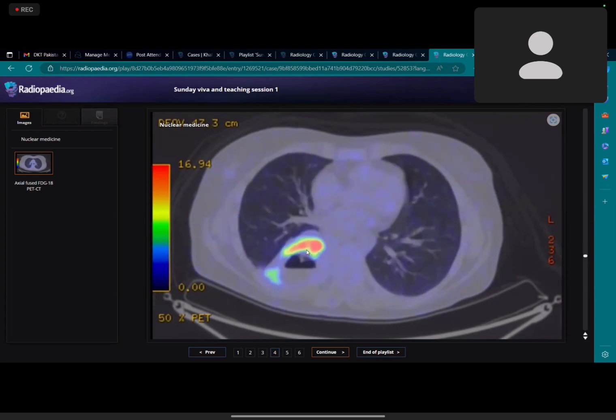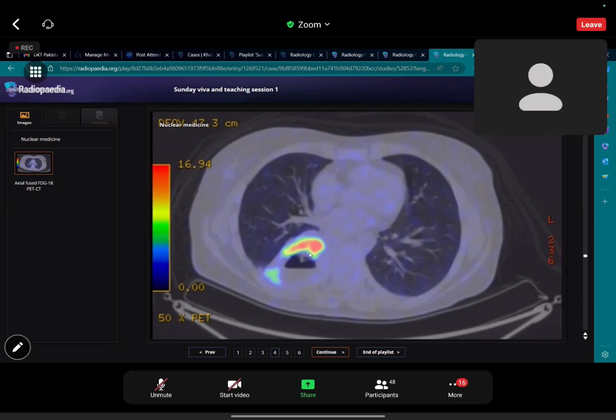I don't know exactly what terminology has to be used for this area of uptake, but I know that this is not pathological uptake with respect to the cavity. The anterior uptake is conforming to the lesion, and the actual site and size of the lesion can then be measured through the adjacent CT images.